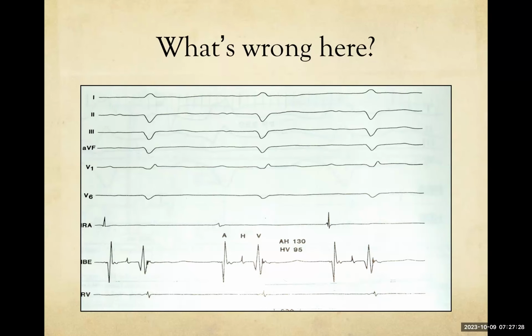So when I'm looking at the intracardiac tracing, it's labeled, there's an A and a V, but if we look at the surface electrogram, it just looks like there's just the QRS complexes. Well, or is it little tiny? Okay, yeah, gotcha. So, again, if you remember, everything's running at the same time simultaneously. So this is the A. So if you look up here, you could imagine that there's a P wave here. For whatever reason, the ECG is not amplified adequately in this tracing, but this is clearly a P wave.